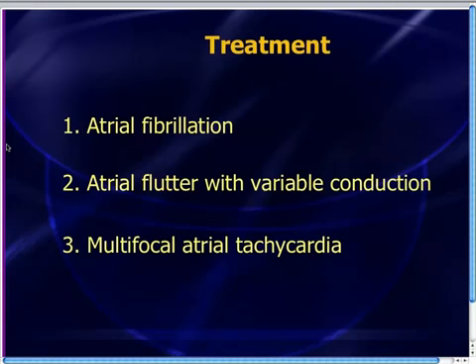And we still see it often in our pulmonary hypertension patients. Well, maybe not that often, but we see it not uncommonly, in our pulmonary hypertension patients and asthma patients. It's not too much theophylline toxicity around anymore, but you will see MAT, and the last thing you want to do is to misdiagnose this the way the computer did as AFib and unnecessarily anticoagulate a patient.